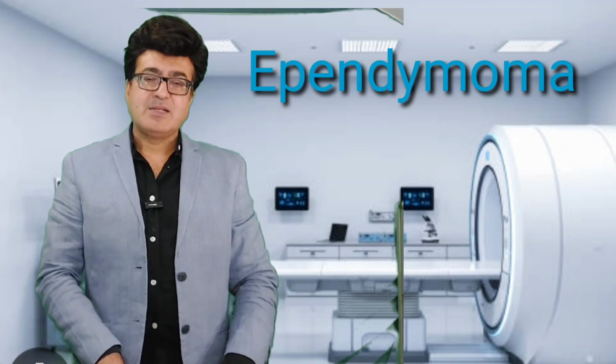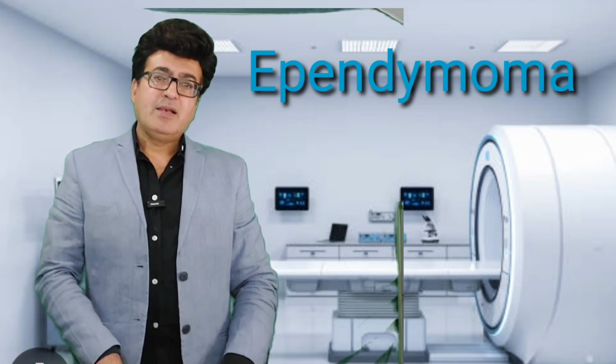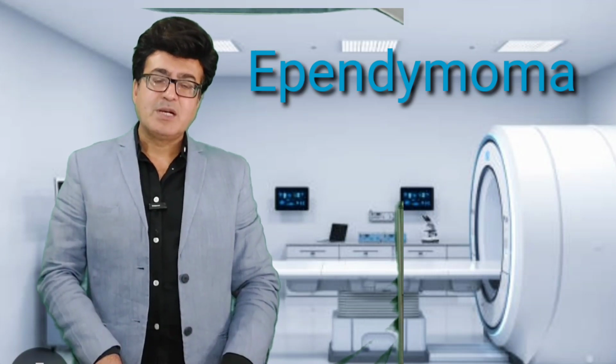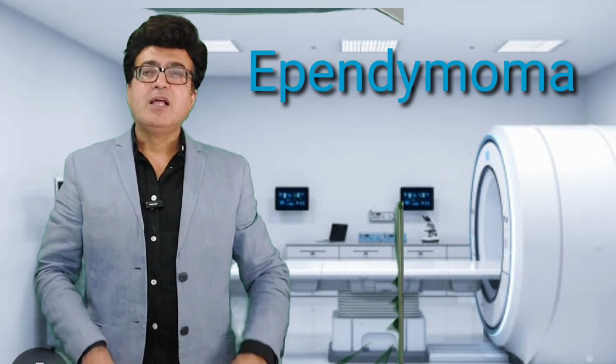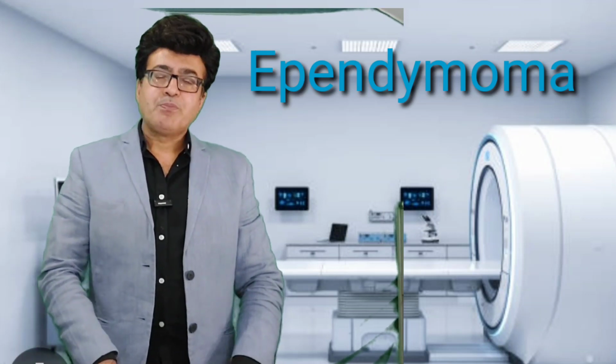Subependymoma is another category which you will be able to see in an older age group, and this would also be within the lateral ventricle or in the fourth ventricle, but two characteristics would be there. There would be astrocytoma and ependymoma combined. That's why it is called a subependymoma.